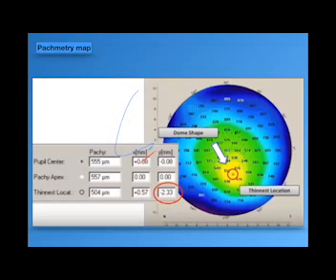I think you joined later. You came late, right? We said that we have to correlate the findings of the Pentacam with the clinical data of the same patient on the slit lamp.